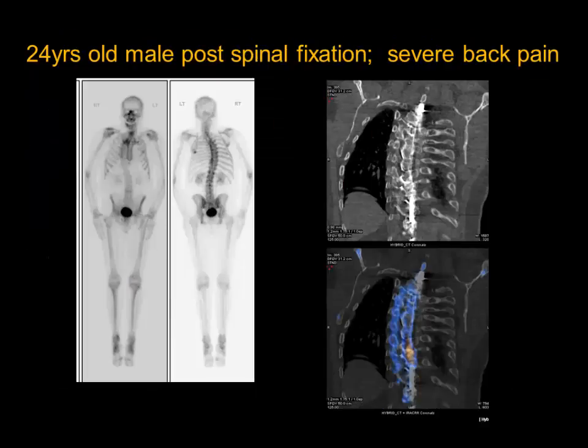Now, talking about the postoperative spine is very difficult, and if you don't window it, and on this projection, I cannot tell you in detail what the interpretations of the images would be. But probably Gopi and I will be having live cases, so that will be the best methodology of explaining and addressing the issues, what you need to be looking at and how you should be reporting.